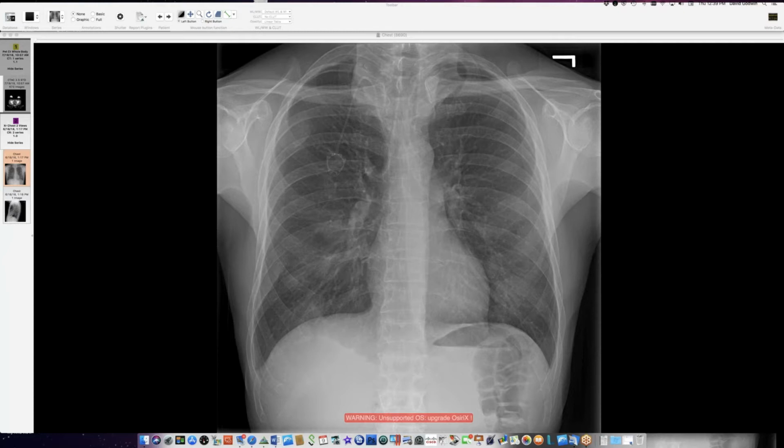So are people viewing a radiograph? Yes. There are these things hugging the upper mediastinum here, and they go nicely above the clavicle, so they must be posterior. And it turns out there are these big posterior masses associated with both sides of the spine.